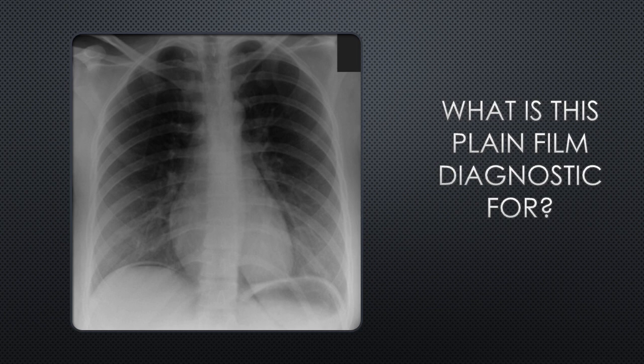Okay, so moving on to the next one. What would this plain film be diagnostic for? Please pause your video. Okay, so this plain film, as you can see here, there's no significant pathology in the main chest cavity.